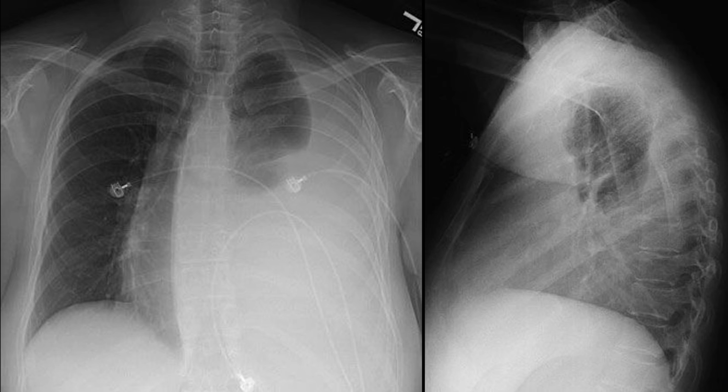This is a two-view chest radiograph of a 42-year-old woman presenting with shortness of breath. The radiographs show increased opacification of the lower and lateral aspect of the left hemithorax, with a smooth upper margin forming a meniscus, consistent with a pleural effusion. There is rightward mediastinal shift and depression of the left hemidiaphragm, indicating a large effusion exerting mass effect.